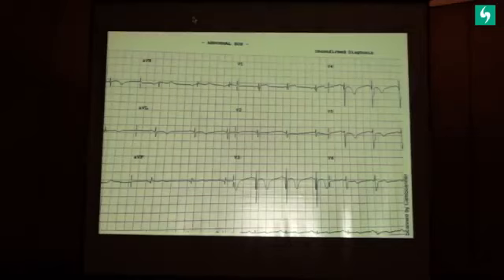The sinus tachycardia has settled completely. These T waves have got inverted, indicating actually reperfusion has happened. They are not a bad sign, they are a good sign, telling you that reperfusion has happened. This ST in AVR is clearly settled now. So this was a good acute reaction to this.